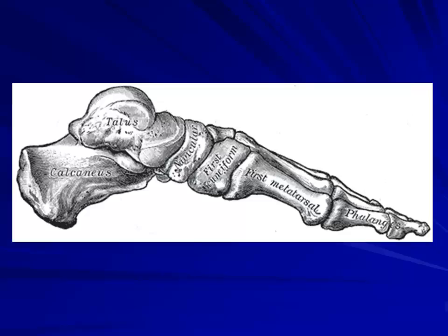So you need to be aware, when you're looking at the SPECT CT, what projections to use and how you want to evaluate an ankle or whatever joint or bone you need to look at. I prefer looking at the sagittal first, and then probably going into axials and then correlating with the coronals.